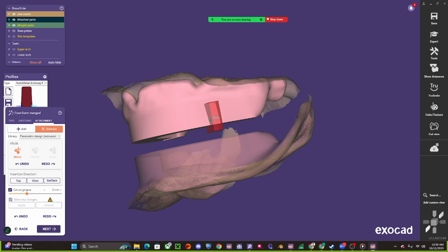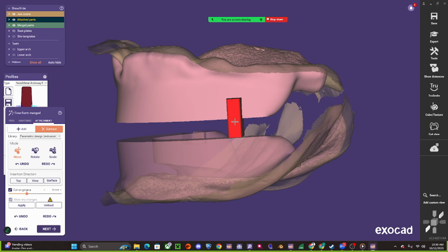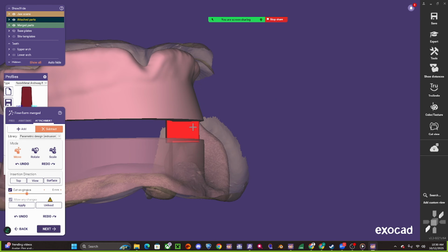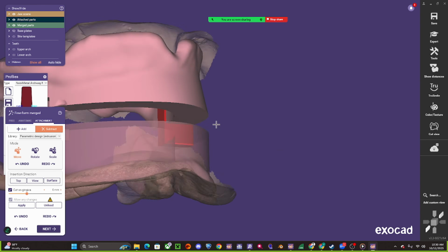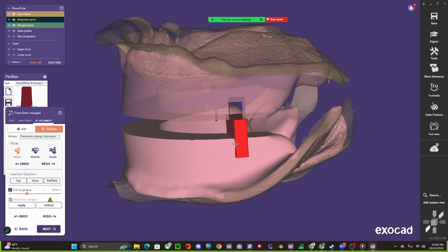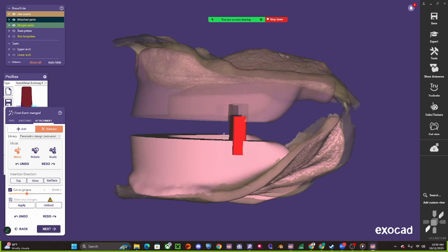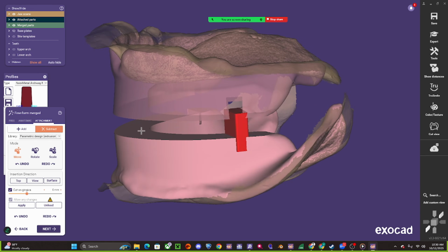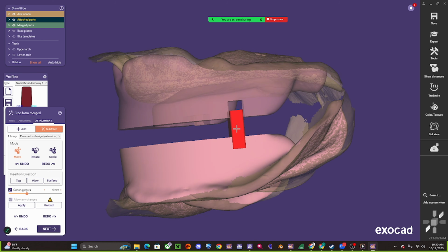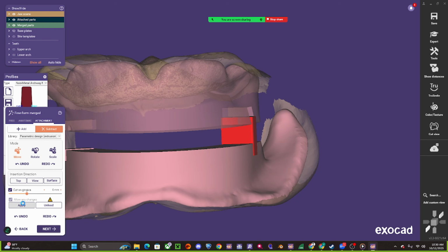I'm going to do the same thing on this side. So that's nice and serrated to add some wax just for retention to hold that on to the base there. There's many other ways you could do this. You can also freeform and mark it, but I feel like this is the easiest and cleanest with the STL subtraction.